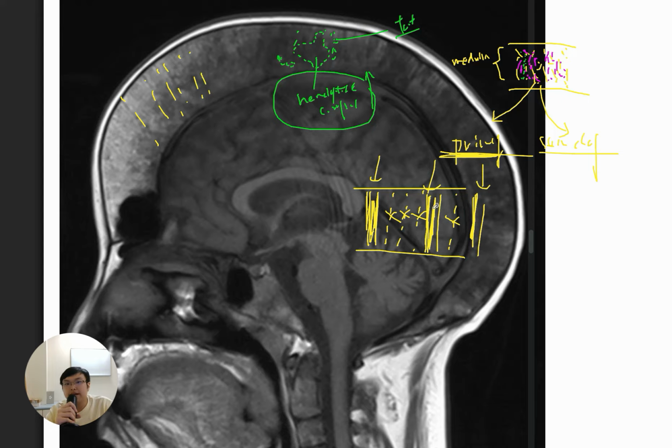When you are thinking along the line of breakage of the trabeculae, you are referring to the less important, thinner secondary trabeculae, while the primary ones are not broken. Instead, because of the broken secondary trabeculae, they take up all the role of supporting the bone, so they need to be thickened. So this is the hair on end appearance.